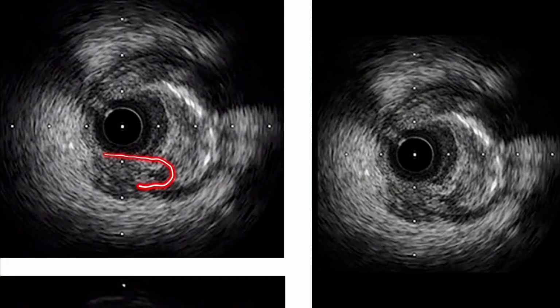So you have softer plaque over here, you have a little more of a fibrous plaque here, you have some calcium deposits back here because you have that acoustic shadowing, and this is a fibrous deposit. It might not 100% be calcium because I can still see behind it.